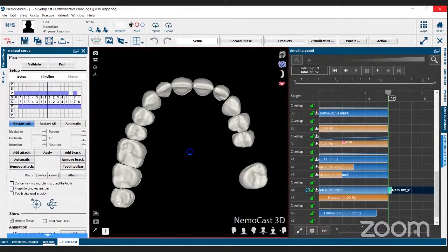And as I was mentioning before, you can look at all the different types of movements by clicking on this icon. But yeah, my computer today is a bit bad. I'm just going to show you that last part real quick, as I know that we're out of time.